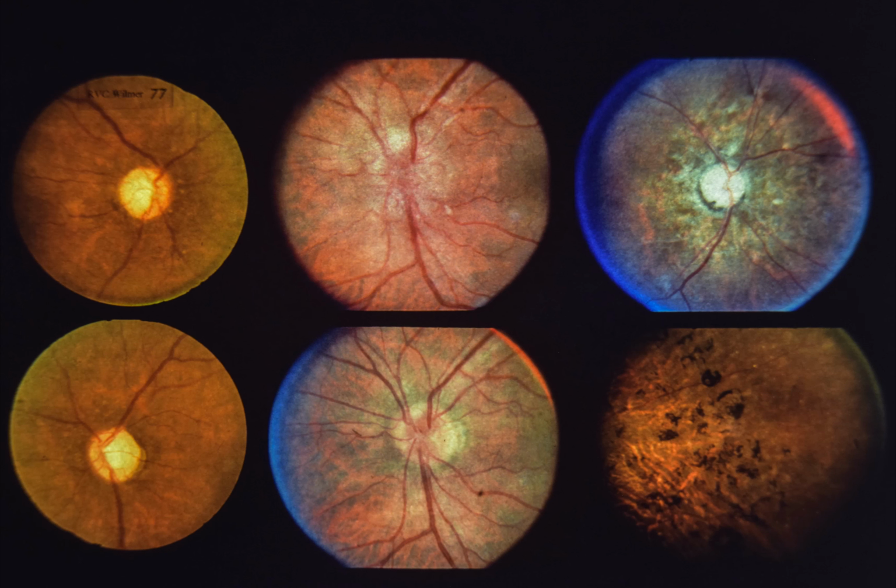Syphilis may involve the optic nerve, choroid, or retina in a variety of ways. Anterior as well as retrobulbar optic neuritis may occur, and bilateral optic atrophy may develop. By the time extensive optic atrophy is present, antibiotic treatment will not improve visual acuity or fields. Upper center and lower center.